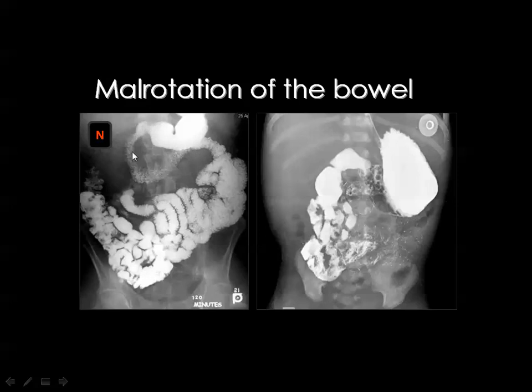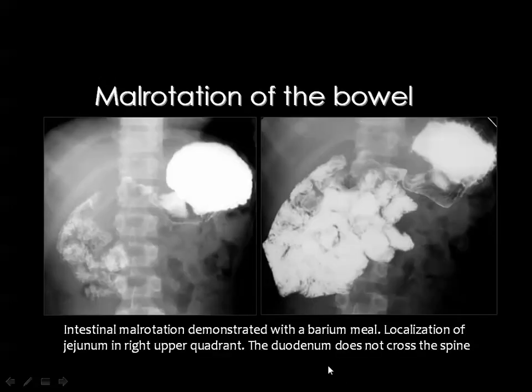This is the normal appearance. You see the duodenum, and you see the site of the ligament of Treitz is to the left of the spine, as you can see here, and these are the rest of the jejunal and ileal loops.